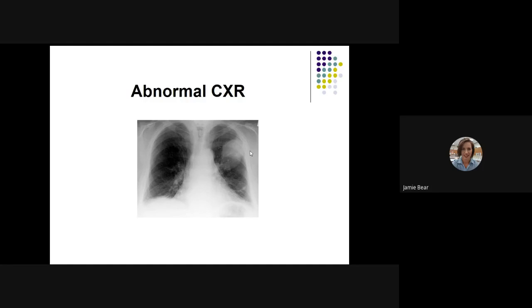Now, looking at this chest X-ray, could you tell the difference if this is atelectasis or pneumonia? Or fluid here? Could you guys really tell? You would not be able to tell exactly what was going on, so they would need to have further investigation. Either a CAT scan or they would need to have a lung ultrasound to confirm that this is probably some sort of a focal consolidation.